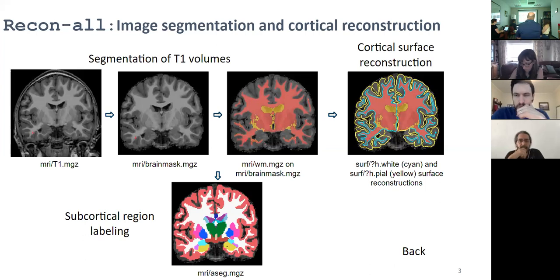So if you could apply some sort of filter and say localize it, this is going in a different direction than I was expecting. It would be good to have some examples here, but if you could apply some filter, say around the anterior temporal lobe, and just essentially brighten up the image, I think that would help with the segmentation of that area and the surface reconstructions.